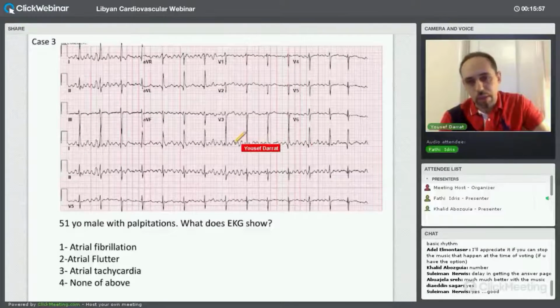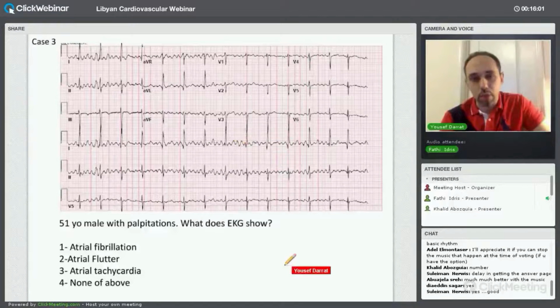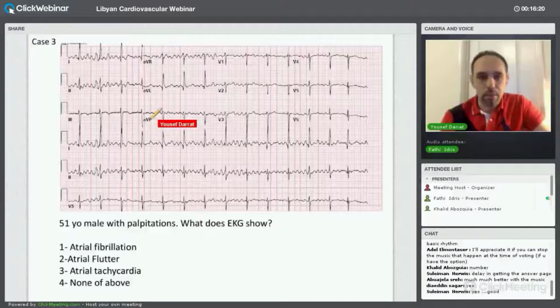The other thing, other than the morphology and how the waves look, is that I'll get the pen again. You can see that the F wave to F wave or the P wave to P wave duration is very non-physiological. There's no way that even flutter would be that fast. So this is an artifact.